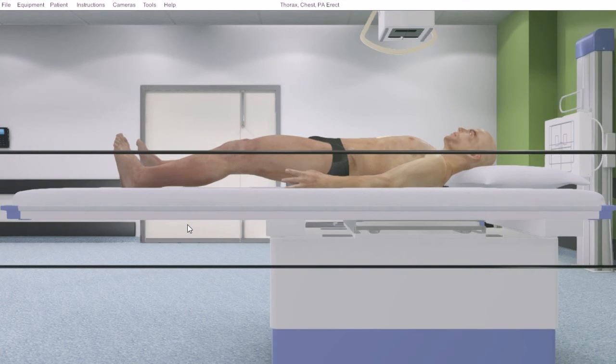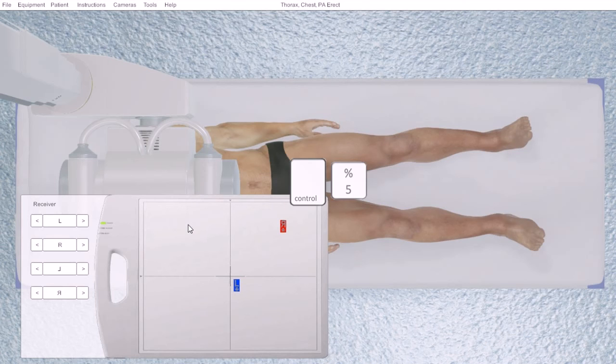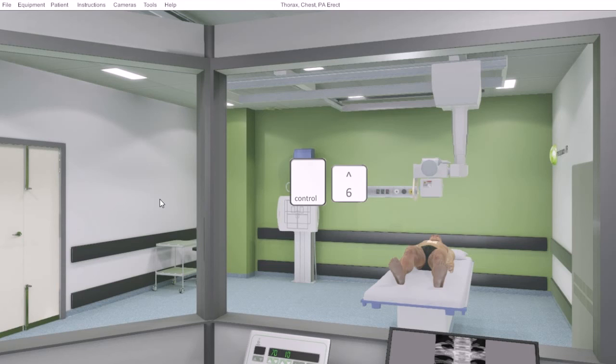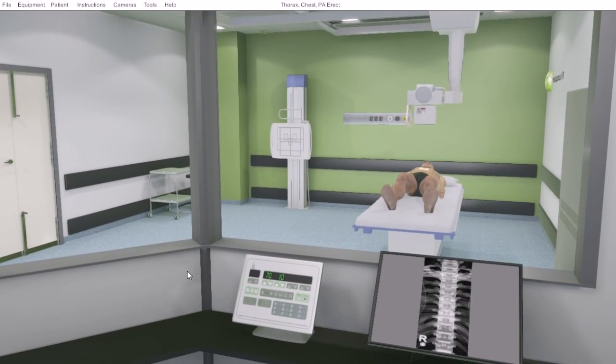We have the other side, which is very useful when at the erect bucky, to come from the side of the patient or the side of the bucky. We have our on top or ceiling view, and this is the tube that's in our way now. And we also have our jump to the exposure control center. We have jumped here and are now in radiographer view.